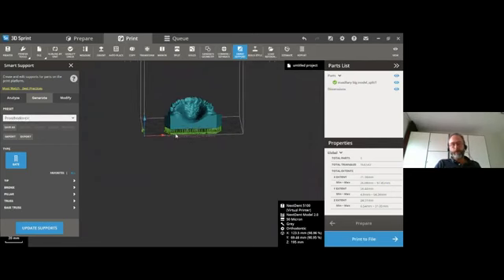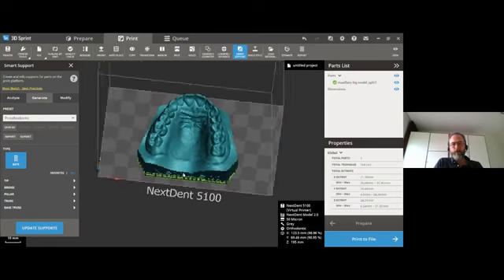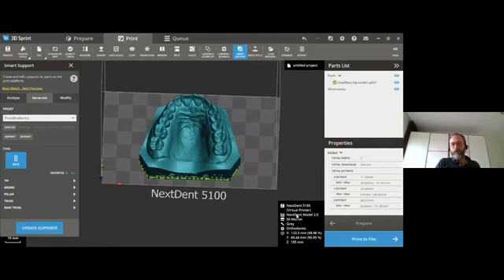We also have the same build style for premium. And if you angulate the model a little bit and you are in premium, you select the angulated build style or support style, sorry, for this. Hope this answers your question. And like Stijn said, it will not overrule the build style. So it's not so that if you change this here, then the settings will be changed there. It's separated. Yes, perfect. Thank you so much.